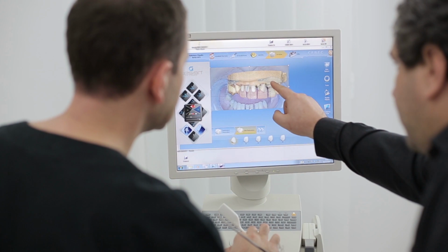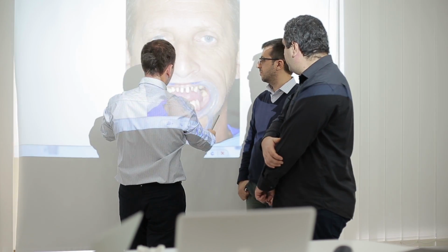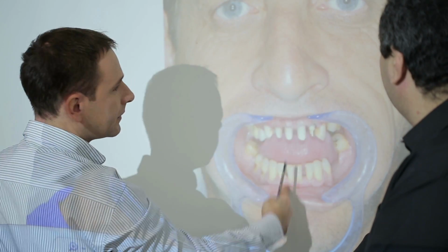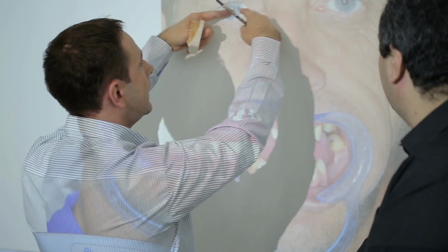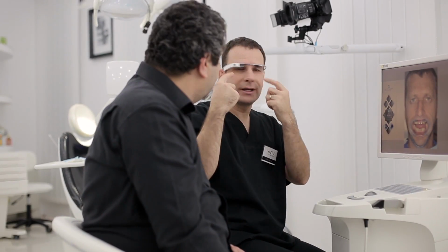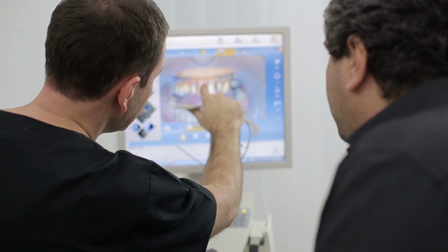When designing the front teeth using 3D software with CAD/CAM technology, the shape of the face, the facial features, the symmetry, and the facial aesthetic are oftentimes ignored, which can lead to serious problems in obtaining the dental aesthetics desired. The G-Design Pro version, developed by the software department of Hack Dental, offers precise guidance when designing with CAD/CAM technology or with any other 3D dental software.